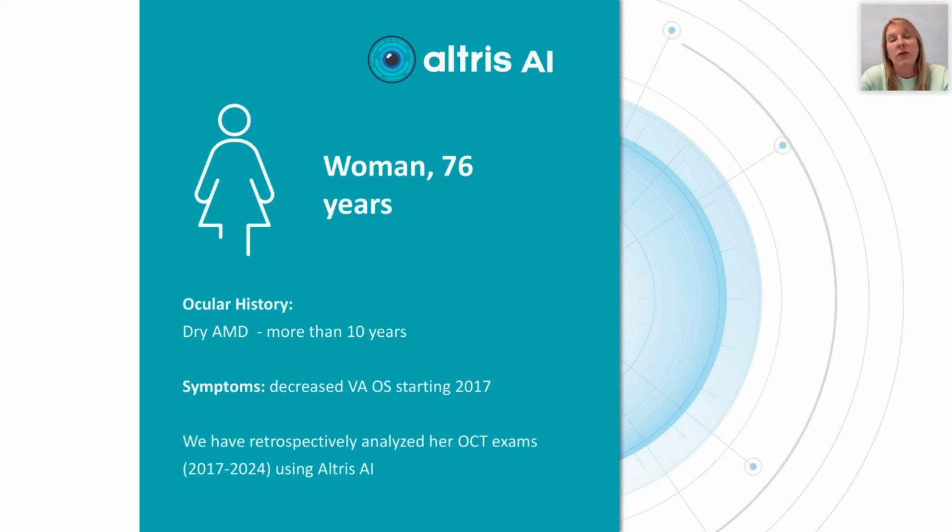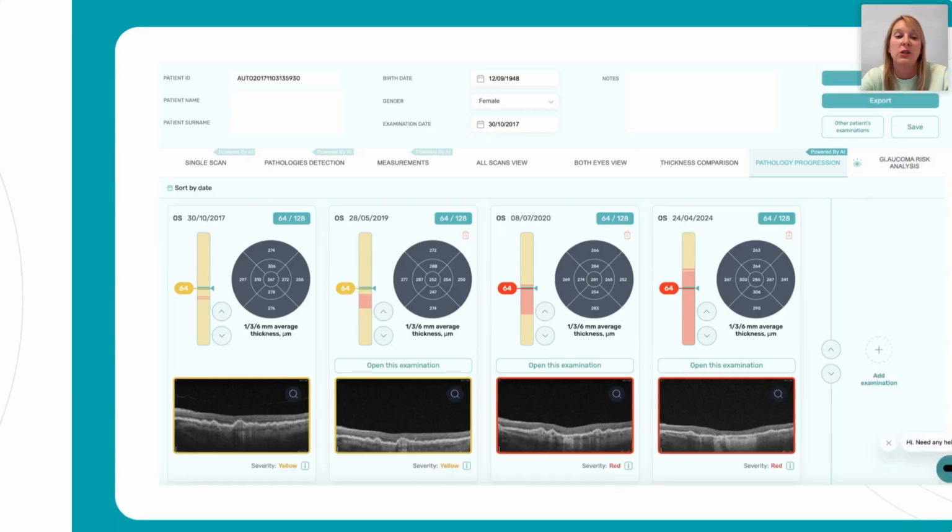She was then followed by us, and we made several OCT exams over all those years until today, and we have retrospectively analyzed her OCT exams from 2017 to 2024 using Altris AI.